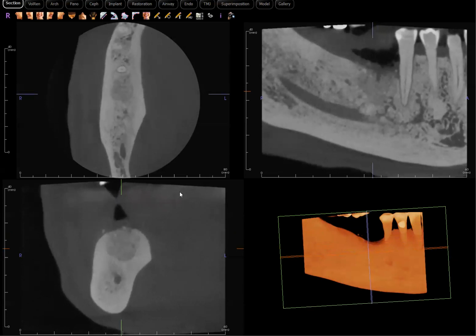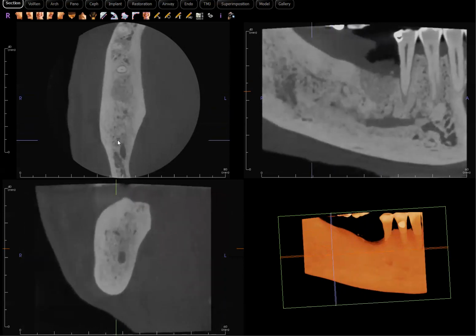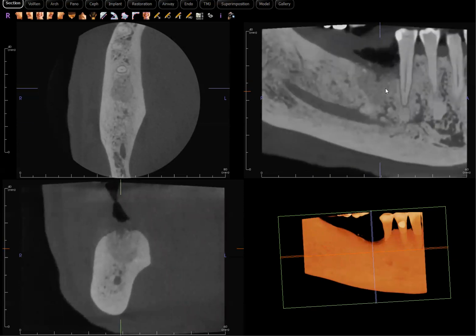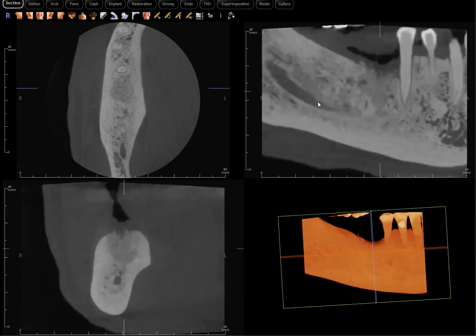So what that suggests to me, I mean, look at that. I'm not seeing much of marrow space at all. It looks as if we have a ridge made out of entire cortical bone, right? So, wow, that is a sclerotic trabecular bone. So that tells me that at the time of extraction, there was probably a long-lasting chronic apical periodontitis along with condensing osteitis affecting this whole area. Hence, we have very sclerotic bone.